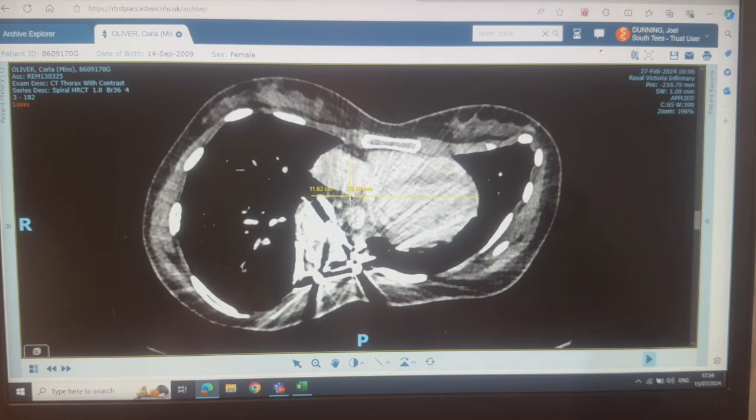So I put it about there. So that was the narrowest point in the atrium. And then the wider part, I'd put it maybe about there. So we're trying to get this minimum point generally in the atrium, but the dip's over here. So that would be the height in the atrium. That's what I decided. It probably is one of those difficult ones.